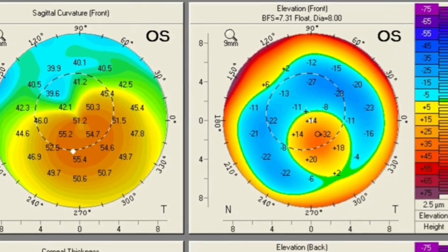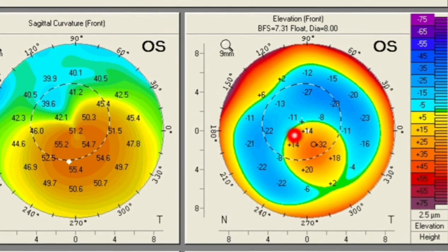So, if you look at the elevation map, here an isolated island-like structure is there, and if we see the thinnest local corresponding point, it is 32, whereas it should be less than 8, and in the central 5 mm area it should be less than 20, where it is 27, 28. So, it indicates some ectatic condition. And another thing that I want to tell you, the minus and plus thing.